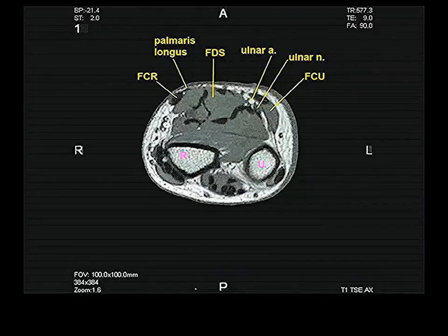And that relationship of the ulnar nerve being posteromedial to the ulnar artery, they're far apart in the cubital fossa. They get closer together as you go down the forearm, but it maintains that the nerve is always posteromedial to the artery. So I know this is the artery, and that's the nerve, deep to the flexor carpi ulnaris.